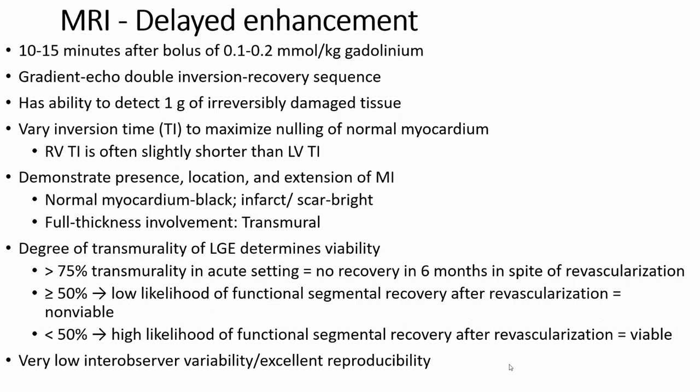Delayed enhancement in CMR has the ability to detect irreversibly damaged tissue.